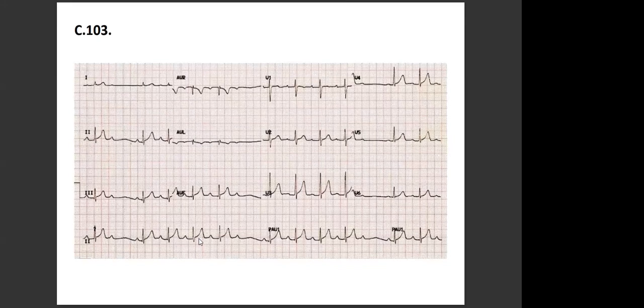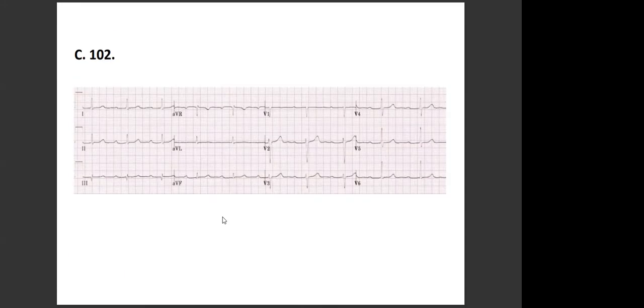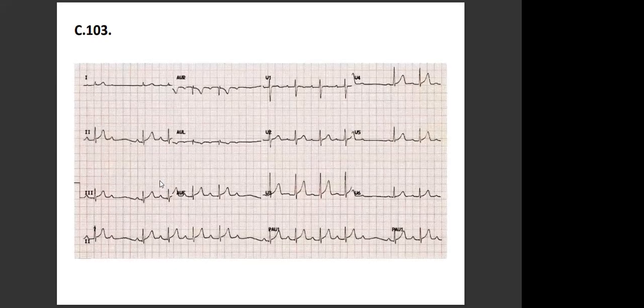So for 102, what was the block? AV block. First degree AV block. Okay, so same as 101 then. Yeah, it's exactly the same. Okay, thank you. You're welcome. I'm doing the 103. Okay, do it.